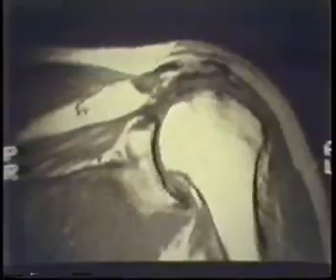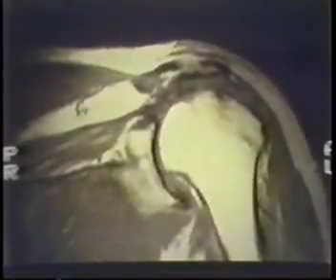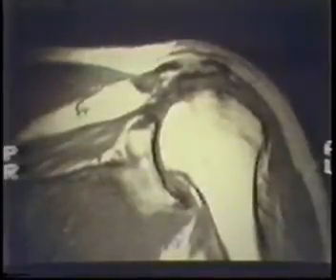A couple of reasons. Actually, as I said before, it may not be best, and I would encourage people to experiment with the thinner cuts. The reason I generally like to go with the thicker cuts, and in this particular place it may be wrong what I'm doing, is generally you get better signal to noise and better contrast differentiation. And the reason I like to do it in the knees is it's the way we do knees, patients can be in and out of the machine in 20 minutes reliably. If you go to 3 millimeter thick cuts, it requires additional pulse sequences if you do the T2 weighted type sagittal images that I have, and it increases the time in the machine.